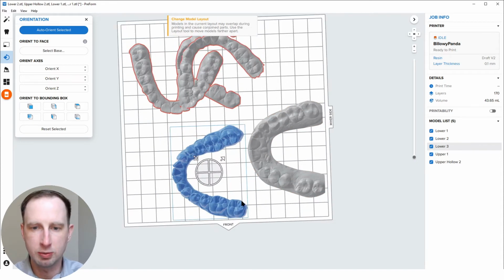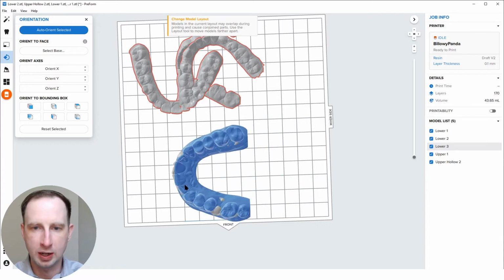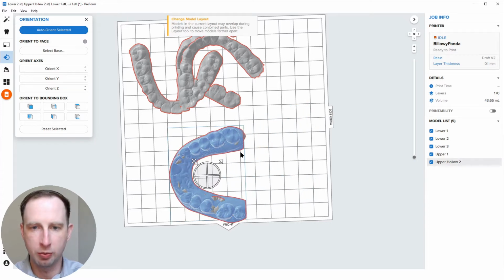So you see the rearmost molar in this line going through this hypothetical line. It does not have to be exact at all, but you want that line going through a similar part of the opposing side of that arch. Put the next one into place, similar. So I want the rearmost molar ending on that line approximately.